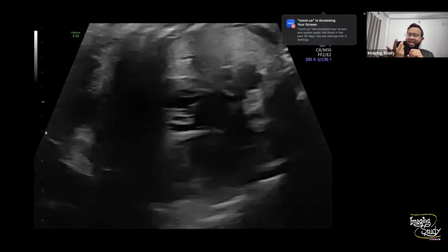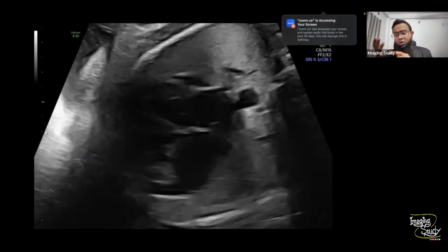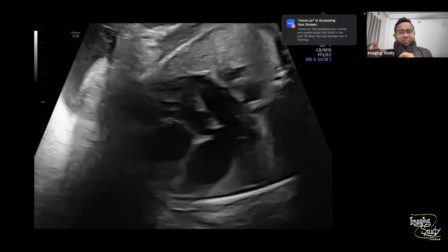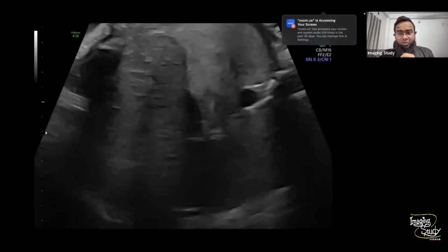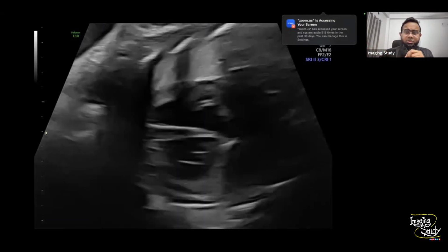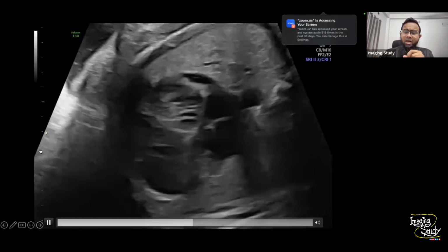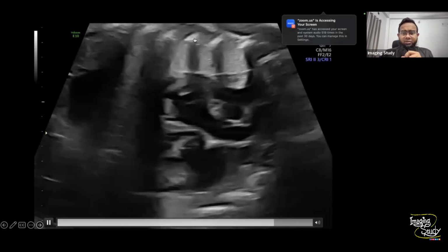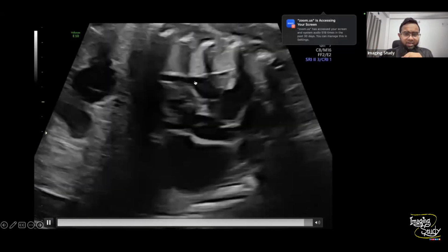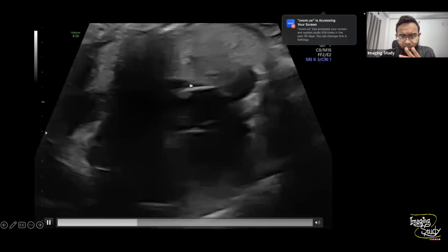So if you can make a follow-up, you will see there should be a development of hypertrophy of the ventricular walls, which is a common association with cardiomegaly in this type of situation due to increased demand or something like that. So hypertrophic cardiomyopathy is a very common feature in these cases. Okay, so again, another finding, we want to solve another feature here.